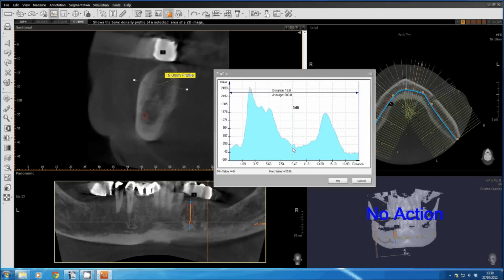It's got a density measurement which is very low here at about 236. Correction, it's not a Hounsfield measurement, it's an approximate measurement. If you then pass all the way through up to the lingual plate, you have a measurement of 1,578, and then you tail off into the soft tissues.